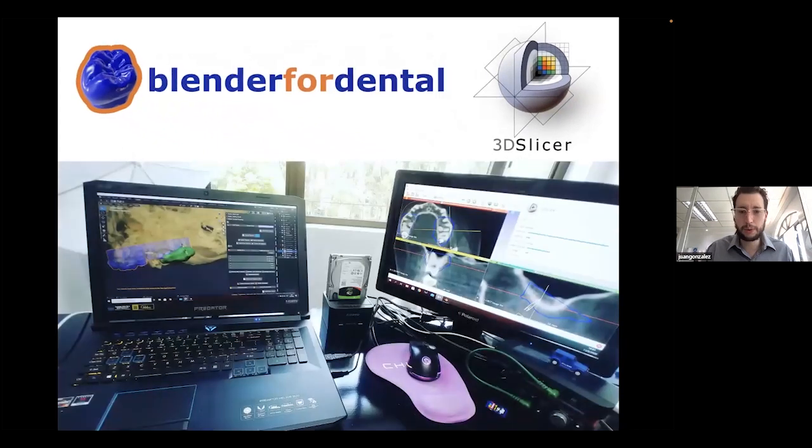So this is the way I work right now, especially since we have two softwares. I like to have two screens, and also I try to make all my diagnosis and treatment planning procedures digital. So I moved from the paper, and since I'm an orthodontist, we like to measure angles and lines and stuff. I moved from that, from rulers and paperwork, to only a digital workflow.